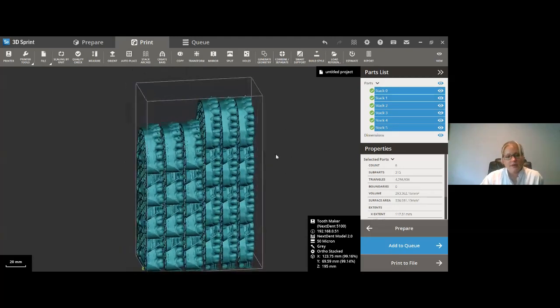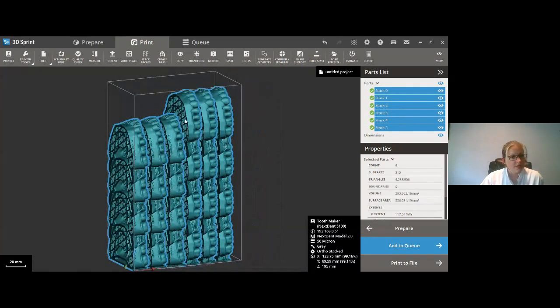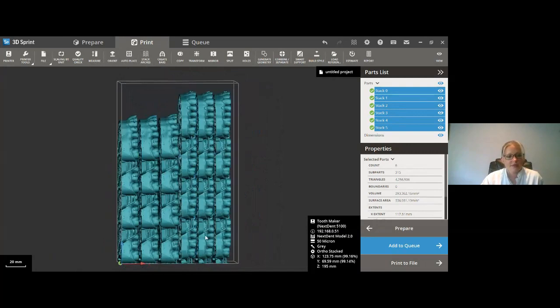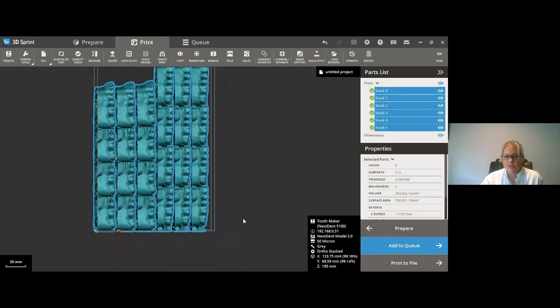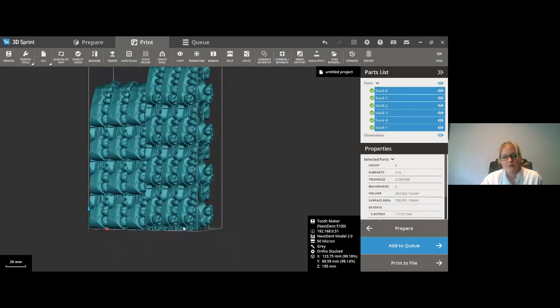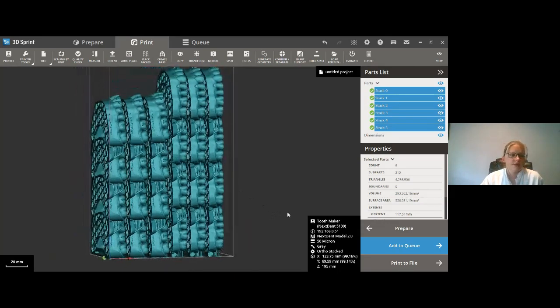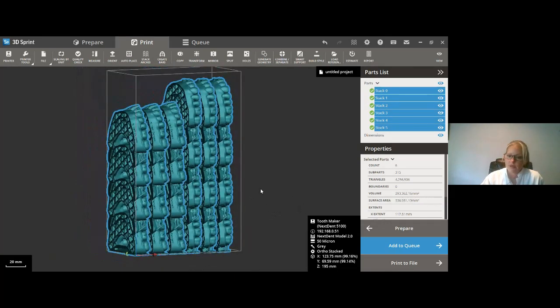If you're not content with doing a hollow model, you can always use the orthodontic build style and just not run the stacking algorithm. You can certainly run solid models, and it's still going to be 30 minutes for a full layer, one level. So you're not forced to utilize this for solid. You don't have to do hollow models.